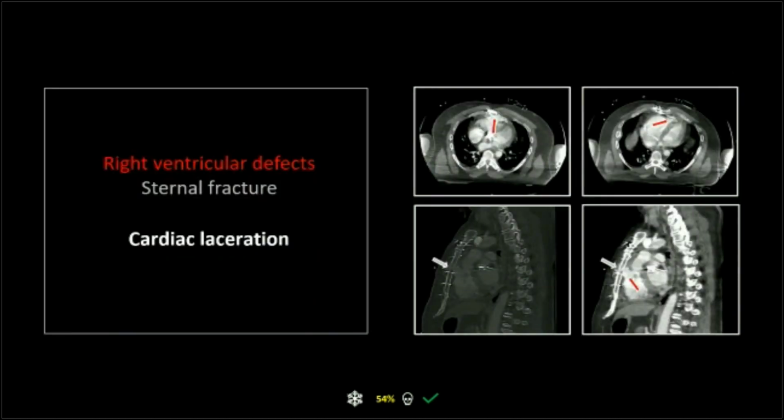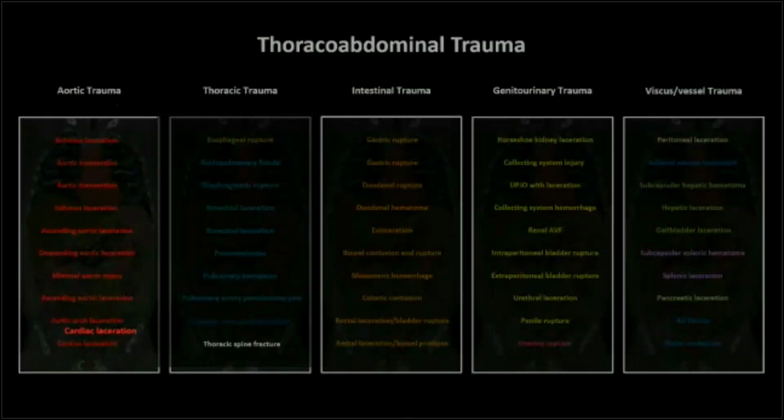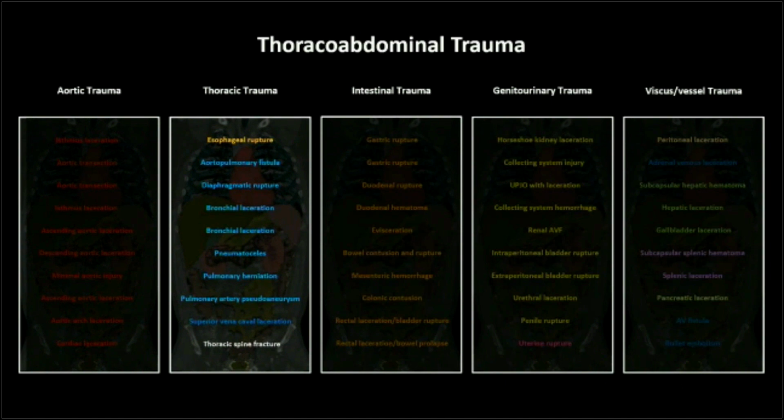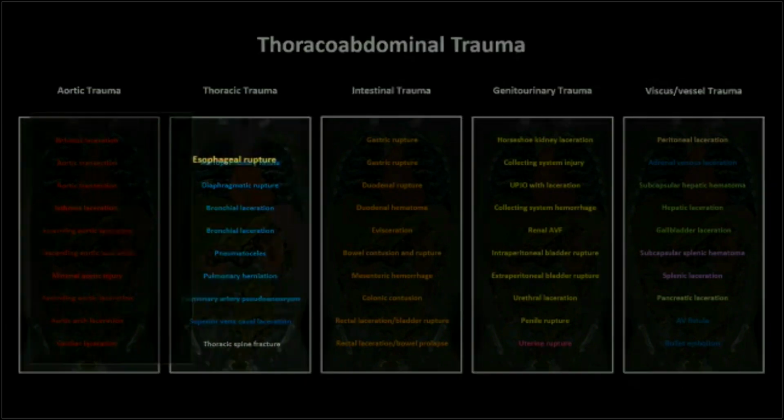All right. It's a cardiac laceration. Incredibly, I have a few of those. All right, let's go on to trauma through the rest of the thorax.